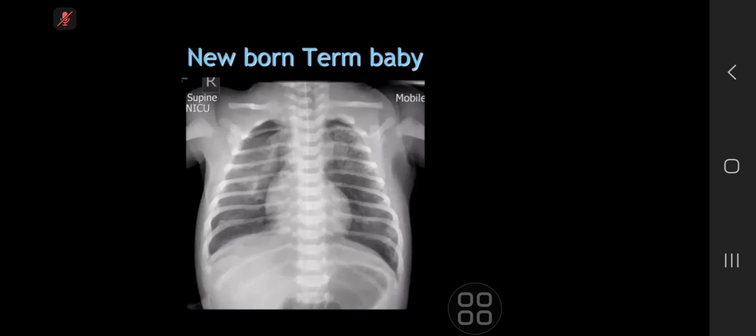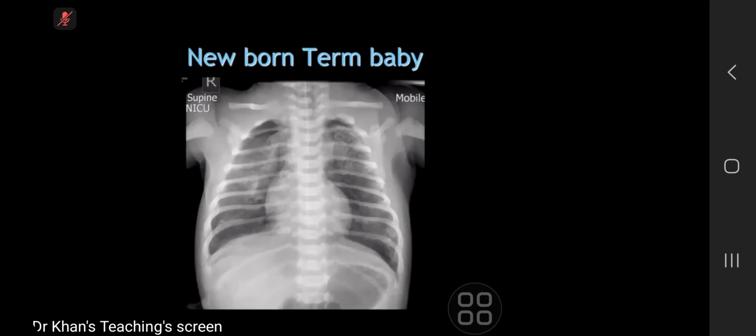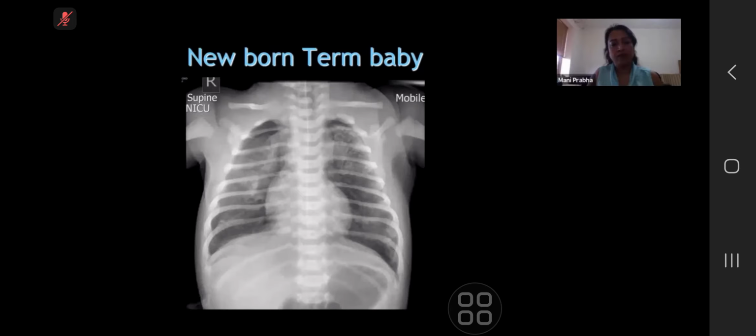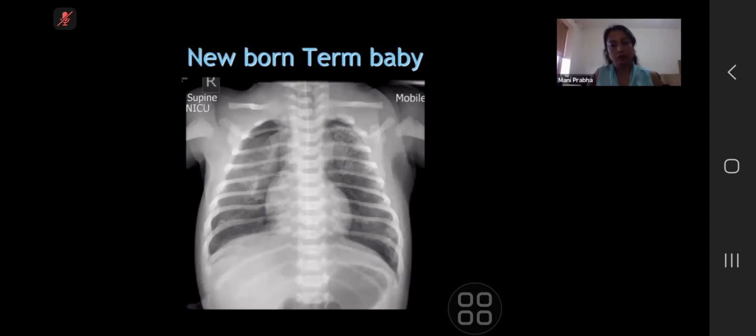This is a frontal chest radiograph of what I'm told is a term neonate. There is an appropriately sited nasogastric tube in situ. The lungs bilaterally demonstrate ill-defined, peripherally predominant opacities. And then biapically there's increased translucency, potentially consistent with small pneumothoraces. Wonderful.